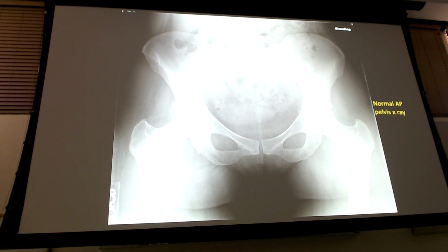Yes? So, there are small things that kind of look like maybe osteophytes. Where? Just a portion of the whole head on the left side. Oh, left side. Right there, that little thing. Okay. Maybe an osteophyte or something. Something as mild as osteophytes? Yeah, no. Because what are osteophytes? Osteophytes are indicative of osteoarthritis, right? That's kind of the description.